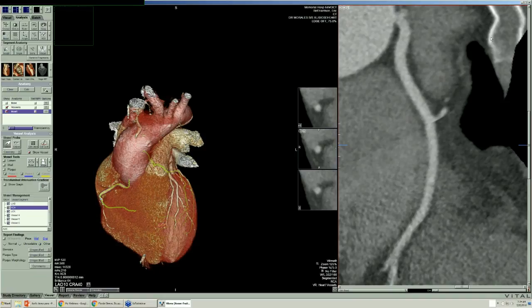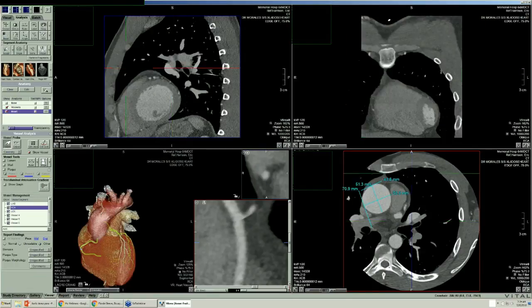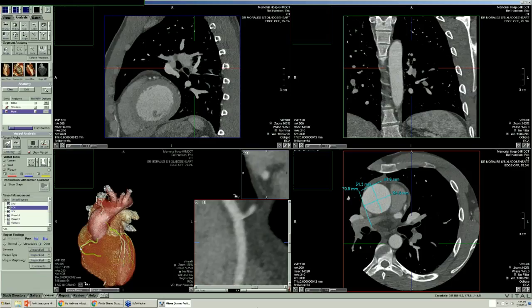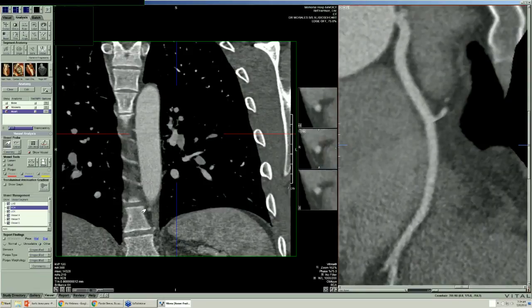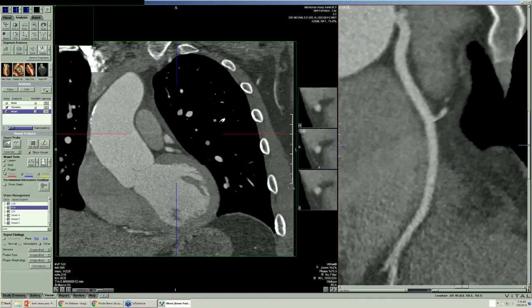I'm glad we have the CT, because the cardiac catheter basically is not quite long enough, and it gets lost in the redundant aorta as it comes across to make the pictures, which I'll show you what that means over here. So if this catheter were coming in, say, the groin, it would come up the descending aorta and then would come around the aorta, and by the time it got all the way around here, down here, and around here, it would pretty much get lost in this aorta because it's so big.